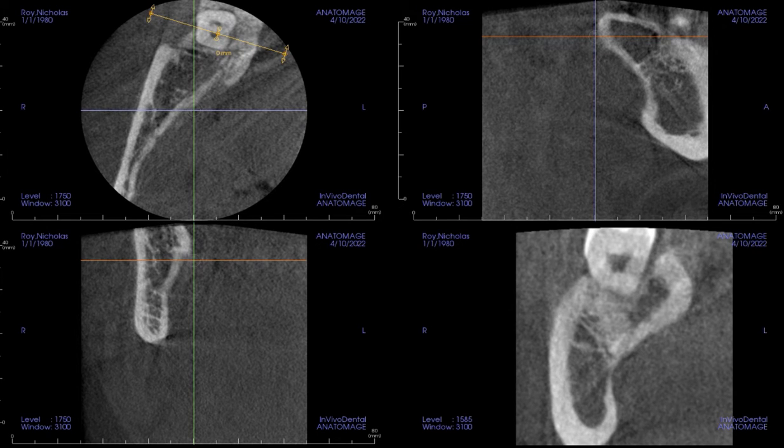Hey guys, this is my clinical CAT scan following up on the vignette I'm tentatively calling Nick's toothache. So again, it was tooth number 31. This was the CAT scan taken the day after I started noticing some discomfort in the tooth. We went over this in one of our treatment planning sessions, but I wanted to go over it again because I have more information at this point. But let's just review what I noticed on day 2.